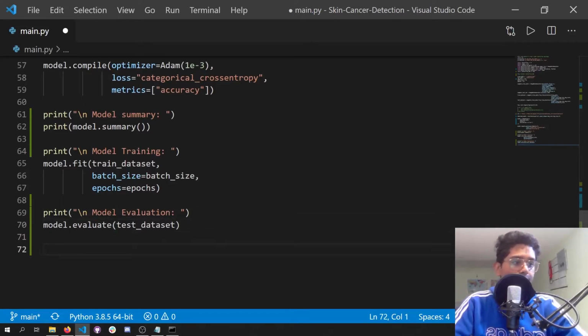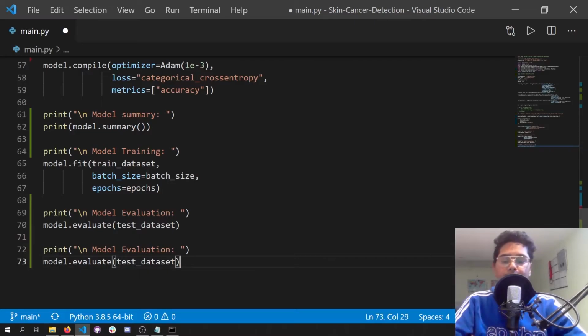We can do one more thing actually. We can also save our model. After we run this TensorFlow script and have the model trained, sometimes if we want to use our model for predictions, we don't want to train the model for whatever epochs and then have it load. So instead we can save the model and then just directly load it in.